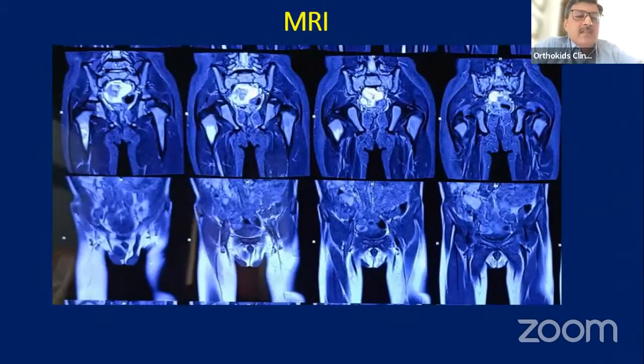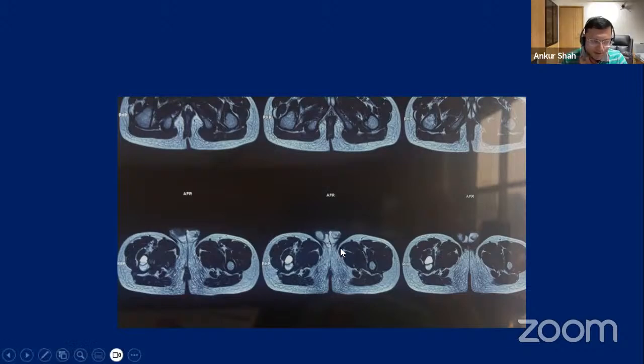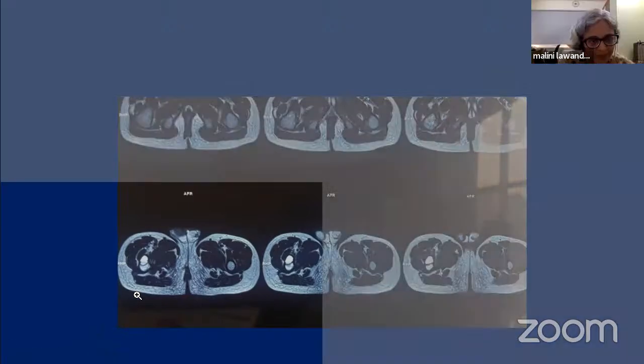Yeah, there is some marrow edema. I'm not able to see. Maybe we have more axial images which can help us. Yeah, we can go ahead. Is there a fluid level, ma'am? We'll need to zoom up a little. I think there is one. There is one probably in the lower image, in the dependent position, here.